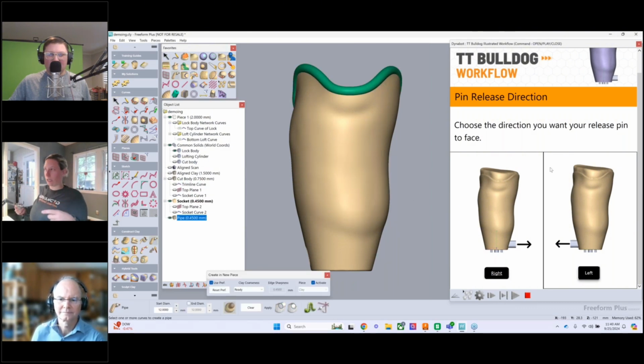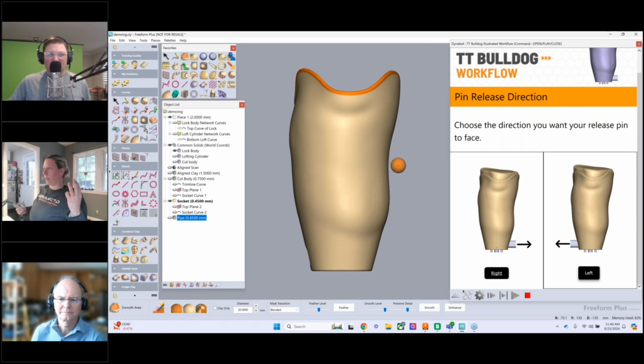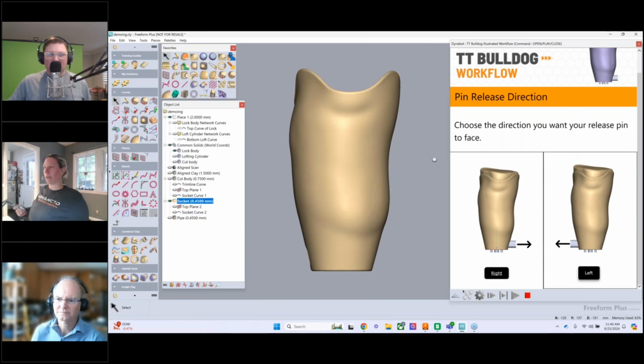And it's changing clay coarseness, it's smoothing, it's doing all of these things on the back end, turning it back into a mesh. Now it's really thinking.